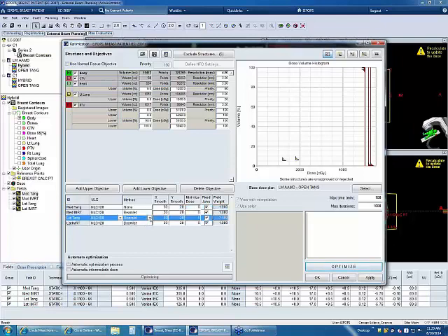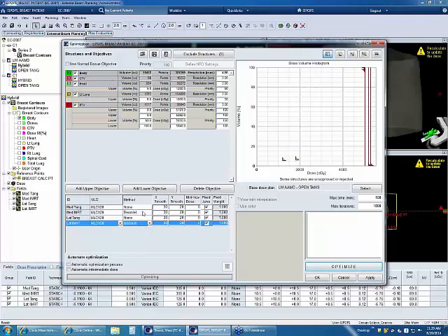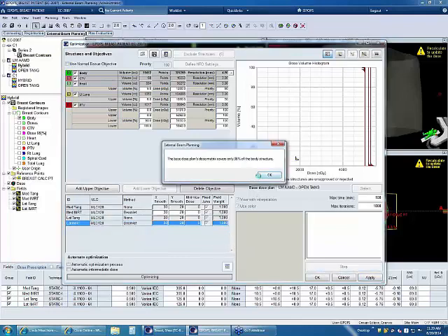My lateral tangent, set to none. The other two are beamlets. This should be fine now. I'm going to apply. I have my open tangents up here. I have full prescription, so I'm going to say optimize. And I'm going to say OK.